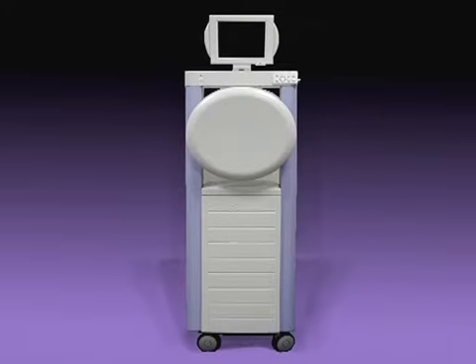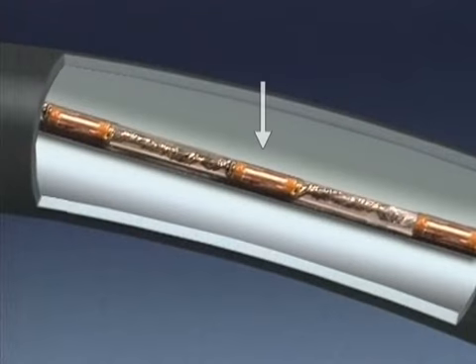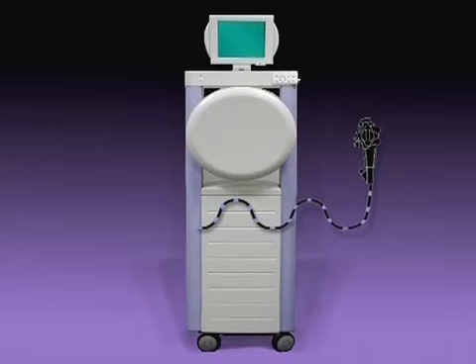Scopeguide 3D imager allows the endoscopist to monitor the looping and location of the colonoscope without fluoroscopy. 16 or more 2mm generator coils are built into the scope or are in a probe inserted down it. 10 times a second, each coil is energized by the field generator via a cord plugged into the umbilical.